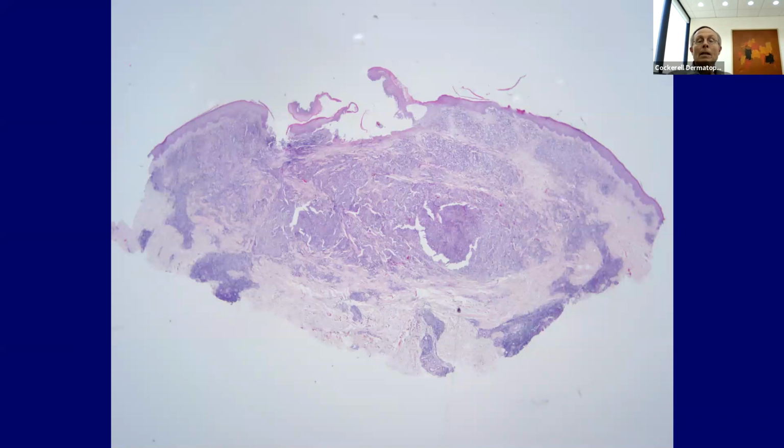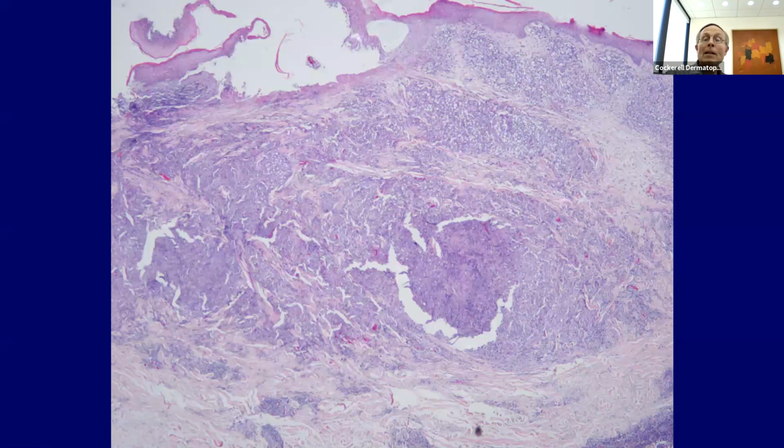Okay, here we've got a punch biopsy, so a different process, and you see it's got this kind of superficial and deep, almost wedge-shaped process going down into the subcutaneous fat here. A lot of these cells are going to be lymphocytes, and these other cells are really pale. So this, at low power, looks like it could be an inflammatory process. And as we go to higher magnification, you can see that indeed these are pale staining histiocytes here.